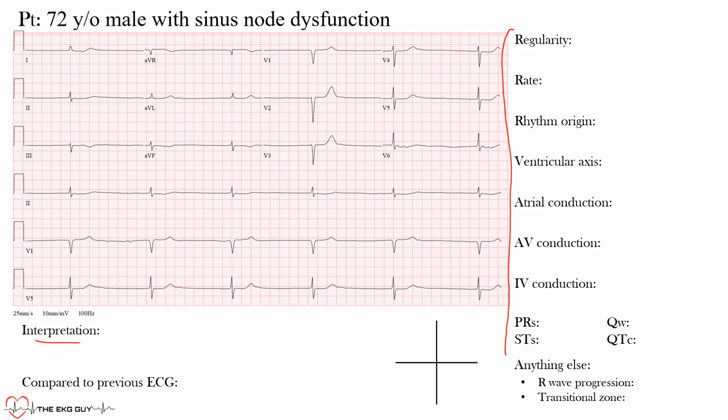Alright, so hopefully you get a chance to go through the EKG yourself. And now let's walk through each aspect of it here so we're not missing anything. This is the approach we've been using and we'll continue to use unless we find something else that works a little better. But first thing we want to do is look at the regularity of the rhythm.